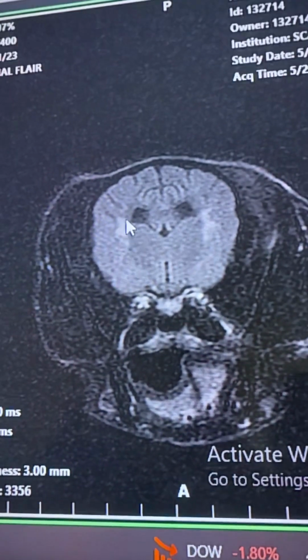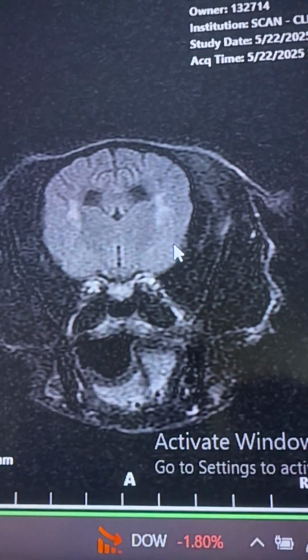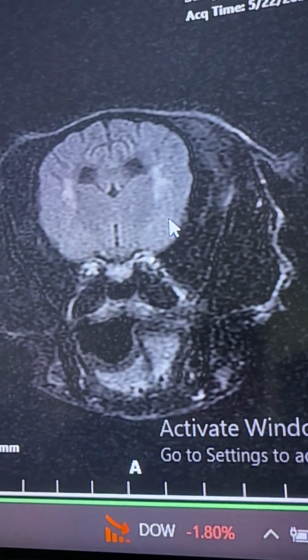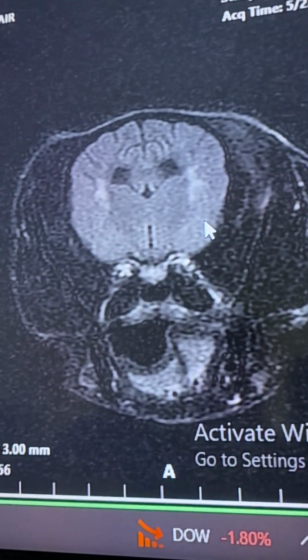So yeah, that's one thing. That's the one thing I noticed. And then, so that white means what? So when I see bilaterally symmetrical bright spots in the white matter of the brain, I think metabolic, nutritional, or even certain neurodegenerative diseases will do that.